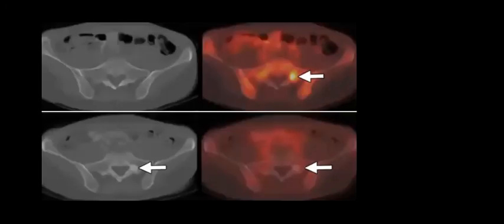Yes, Hiba, Rabab, perfect, good discussion. Yeah, regression. So now we have one radiologist and we have one from the team of the PET-CT. So how can we combine the two reversed ideas? In this image, the radiologist says that there is progression, and in this image, let's say the PET team says that there is complete metabolic regression.